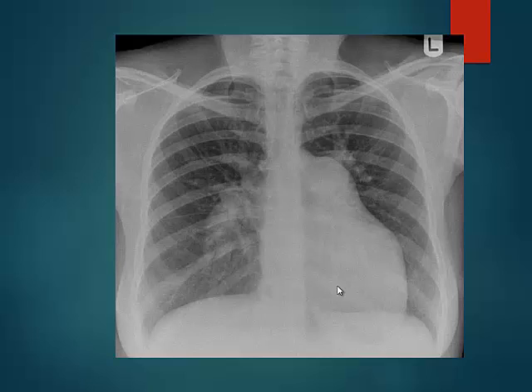Yeah. So this is idiopathic pulmonary arterial hypertension. Idiopathic, because pulmonary arterial hypertension is a broad term, isn't it? Whichever condition you have with raised pressure in the pulmonary artery, you could call pulmonary arterial hypertension. But probably idiopathic pulmonary arterial hypertension is what would cause massive enlargement of the central pulmonary arteries.